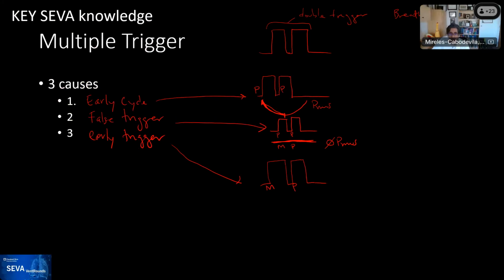Rob, did you want to draw in the PMUS curve on the last one? Oh yeah, sorry. Thank you very much. So in this one, the breath goes like this, and then there's evidence of PMUS afterwards. So you can see that the ventilator triggers first and then follows the patient activity, which triggers the next one. Thank you, Roberto. Sure. All righty.